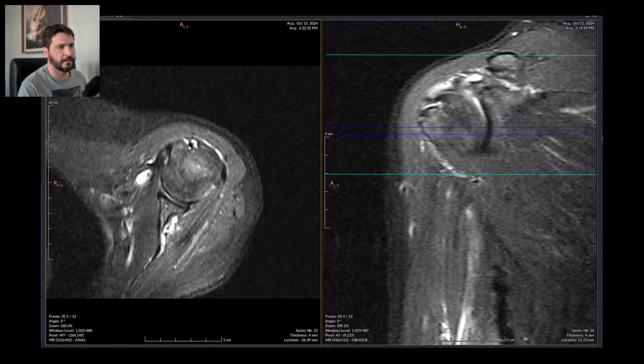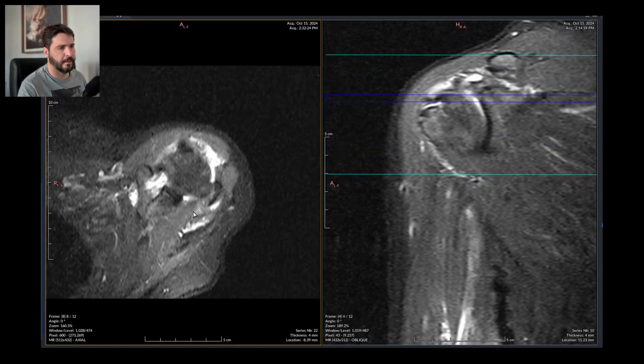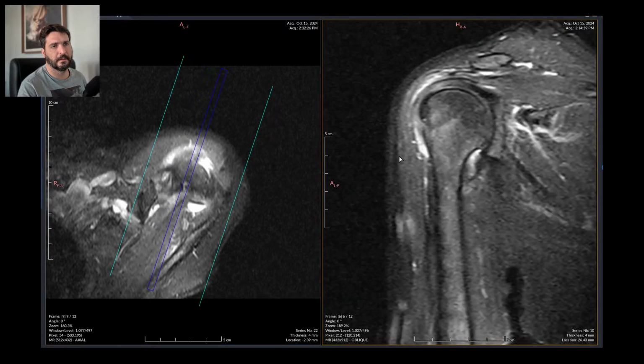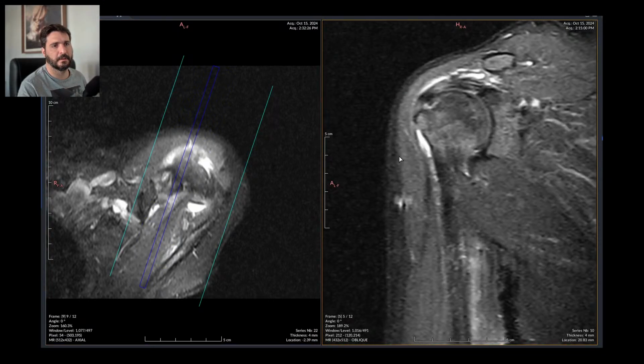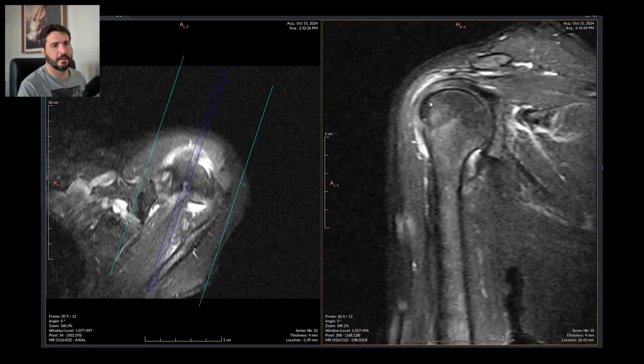So it's right here. There is fluid distending its sheath, and it's here. It's not ruptured, but it's clearly thickened, and it has some degree of supraspinatus, tiny portion, and the long head of the biceps tendon right here, there, partially with clear signs of tendinitis, tenosynovitis.